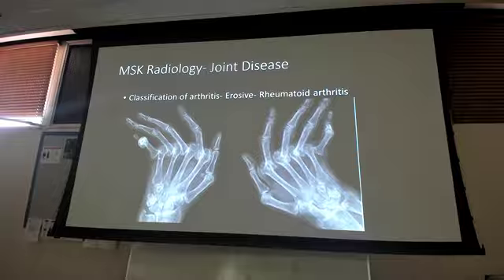So what that is, and bear with me because I can't do it because I don't have rheumatoid arthritis, is the joints are so swollen and eroded that her pinky comes out, the middle phalanx is straight down, and then the distal phalanx is back out. So that is a cross section of the middle phalanx because the joint is so eroded and swollen that when she tries to lay her hand out, it is vertical. And she can't straighten that finger out. And that's what that looks like. That's that cross section of the phalanx.